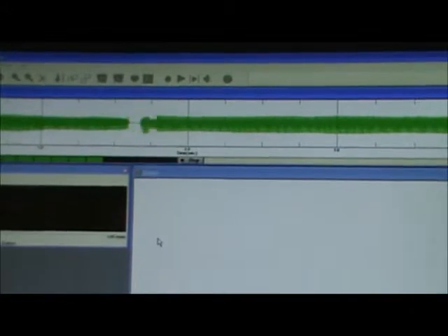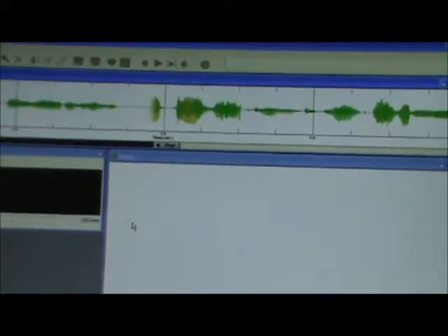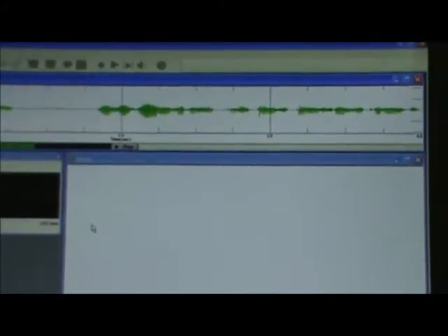That's fine. Okay, so in my normal pitch, I'm going to go, and right there it wrapped around. Now I would need to hit the space bar right away, so I'll hold onto the mic and drop the camera to hit the space bar so you can actually see an analysis. So let me do another sustained vowel. So that's what your sample should look like.